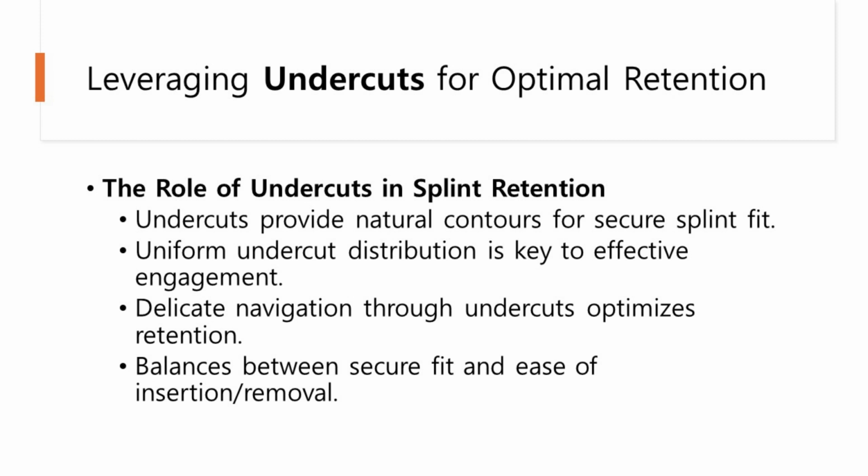When setting the insertion path for a dental splint, it's essential to navigate these undercuts delicately. This careful navigation ensures the splint can be inserted and removed easily by the patient or dental professional, while still maintaining a secure fit on the teeth. The balance between a secure fit and ease of insertion and removal is paramount. Ensuring this balance is key to the successful application and functionality of dental splints in patient care.